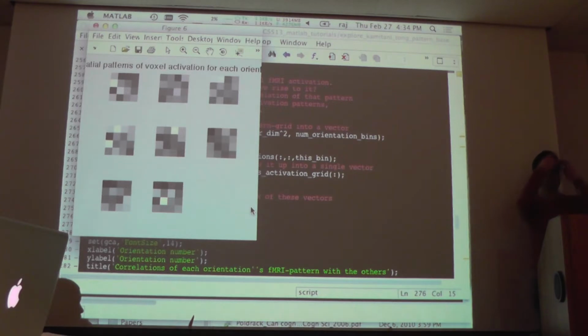We haven't talked about this yet, but there's a very popular method of doing fMRI analysis, invented by Kriegeskorte, whose name comes up a lot in the readings that I've assigned because he's done fantastic stuff. You basically go through the brain and take a little local neighborhood, another local neighborhood, another, and work out the pattern differences or similarities within each of those neighborhoods.